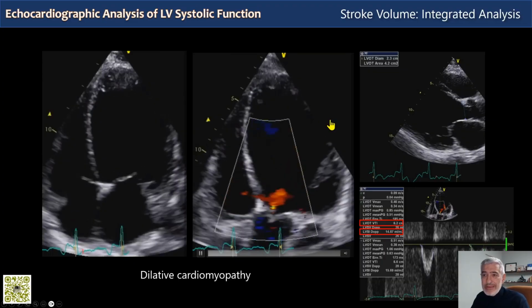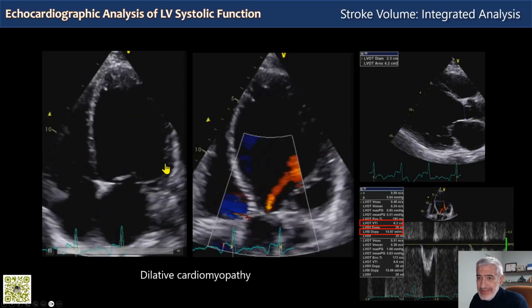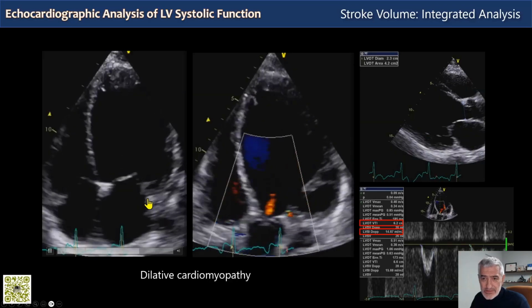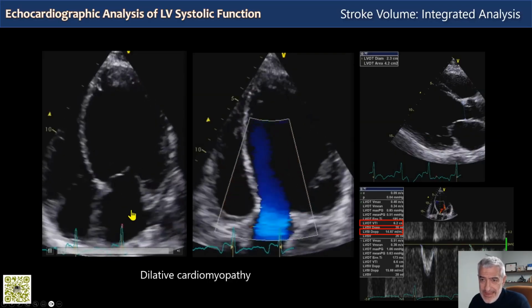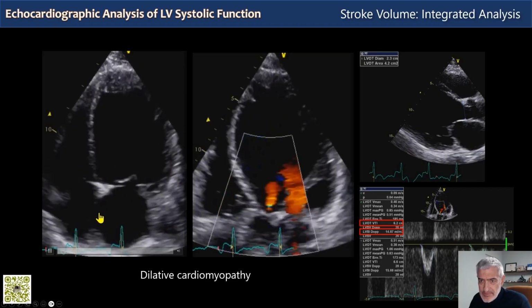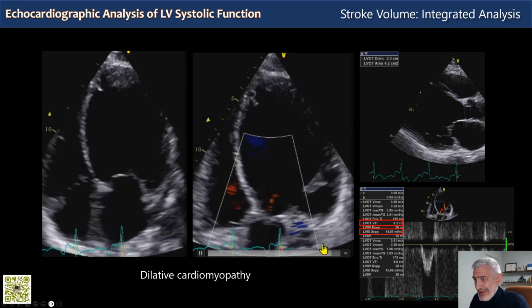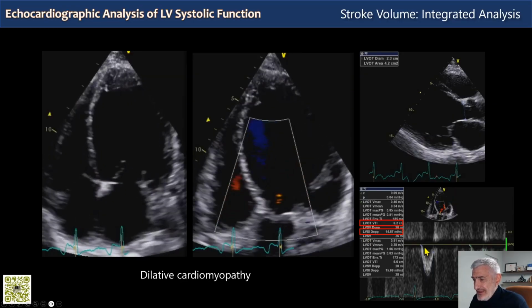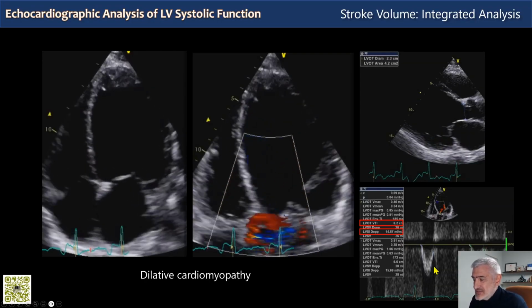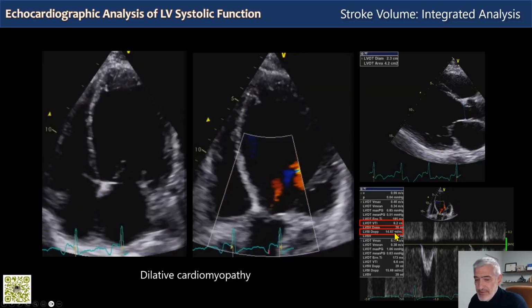And these are the apical images from the same patient of the previous slide with dilated cardiomyopathy. Again, look at the apical four-chamber view of the left atrium. No reservoir expansion of the left atrium during atrial diastole, which is superimposed on the ventricular systole. The base does not descend, no expansion of the septum, no expansion laterally, fixed superior wall, and the VTI of the LVOT is very reduced, 6.2 centimeters, with an extremely reduced stroke index of almost 15 milliliters per square meter.